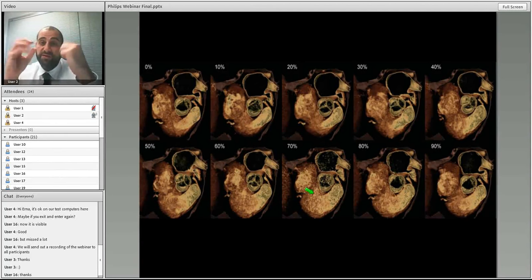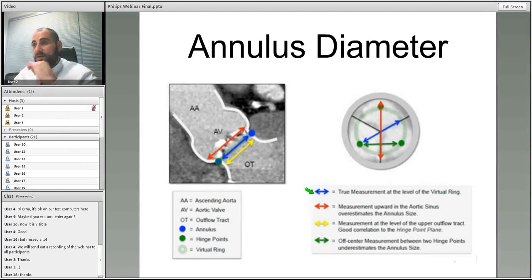There are big effects when you have a small diameter in the systolic phase versus a larger diameter in the diastolic phase, or vice versa. So it's important when we scan these, we'll look at retrospective coronary CTA to allow us to look at this quite nicely. But this is the cue right here.